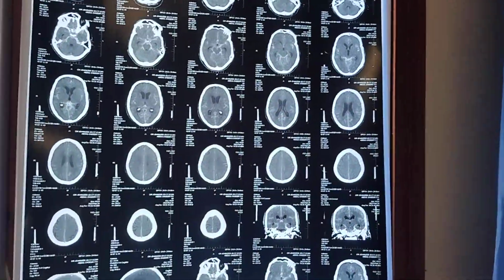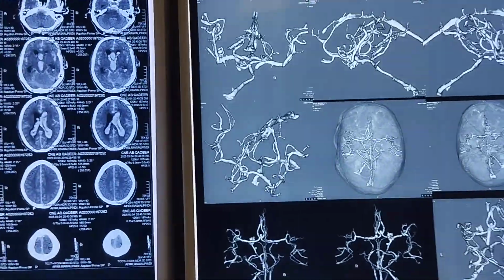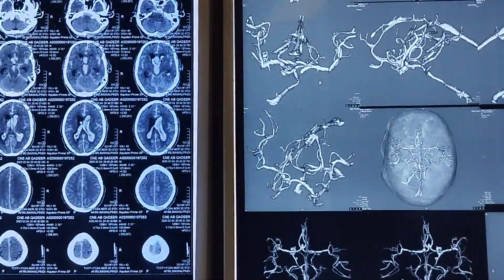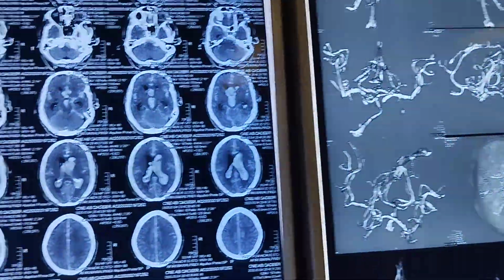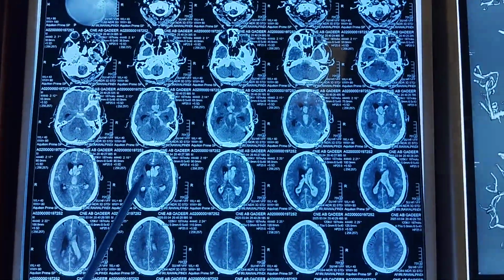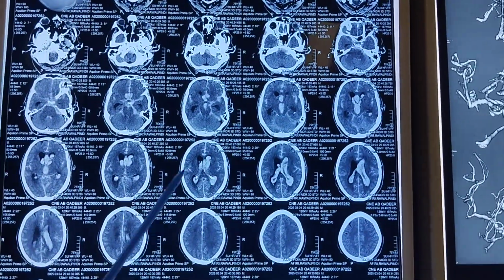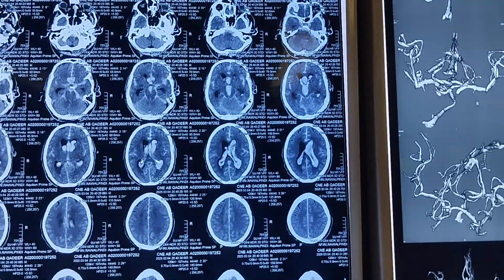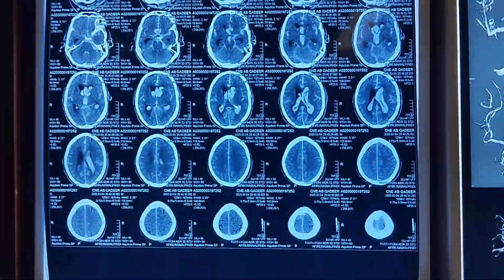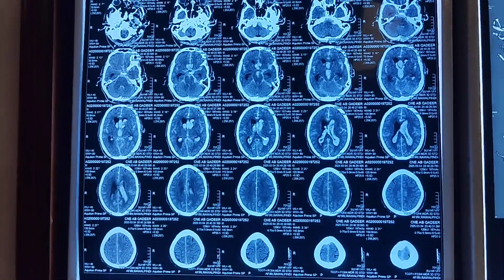Unfortunately, this patient came to us very late, and we were preparing the patient for coiling, but before the coiling the patient had a rebleed, because of the re-rupture of the aneurysm. And now you see this CT brain. Everything you see white, hyperdense, all these are bleed, and this bleed is now causing pressure in the brain and also hydrocephalus, and the mortality of this patient is 100%.